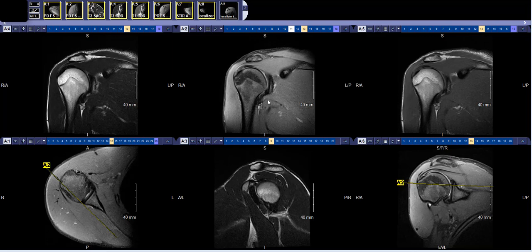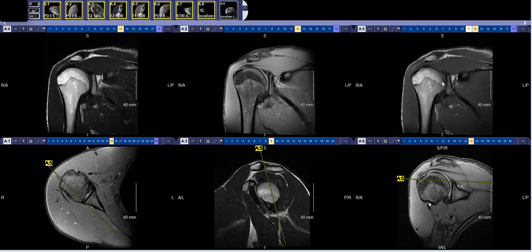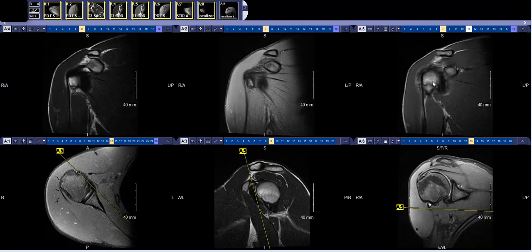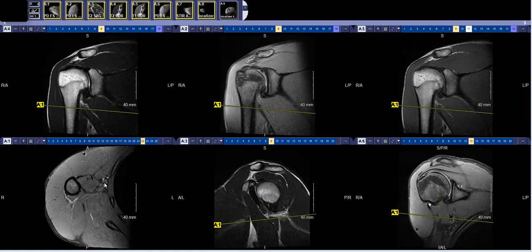And as I'm looking for that, I'm also taking another look at the inferior capsule of the glenohumeral joint, the axillary recess here, looking to see if this capsule is thick or if there's increased signal, which may clue you into signs essentially of adhesive capsulitis. After that, I return to the coronal sequence in the T1. So now I'm going to look at marrow. Essentially, I'm looking to make sure that our marrow's bright on our T1 here and there's no pathologic marrow replacement process. After I look at marrow, I briefly scan through the axilla, make sure I'm not missing anything in the axilla, on our axial. And that's the essentials of my search pattern.